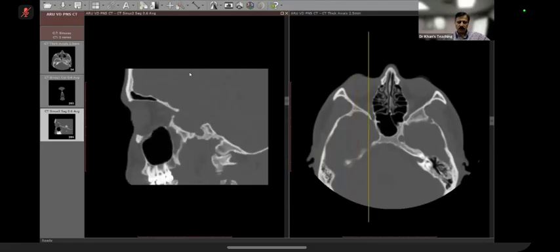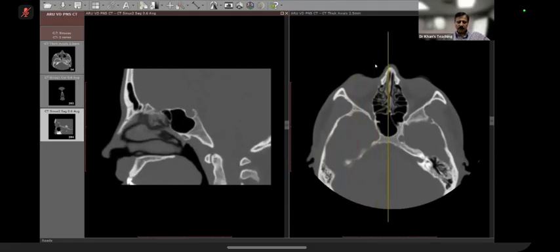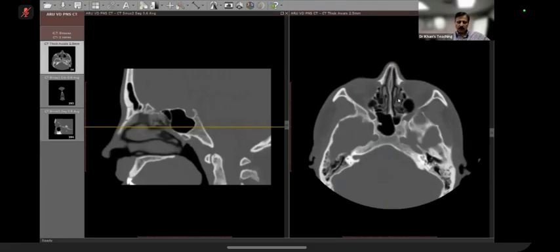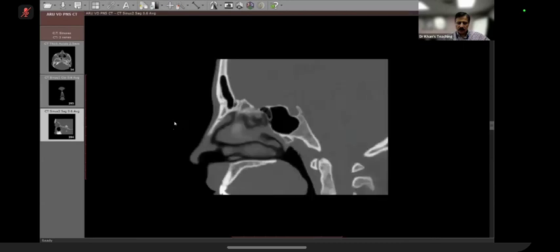And generally speaking, let's see it on a sagittal and try to orient it. You can see it very well here. Do you see this ostium here, which correlates with this thing? So this is the ostium of the sphenoid sinus, and from here the secretions will come here.